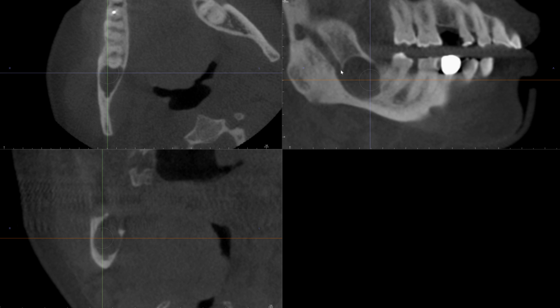That's because it's right now right up against the mandibular canal, or inferior alveolar canal, which has been displaced, as you can see, inferiorly. Not only has it been displaced, if you compare the dimension of the canal that's located posterior to the lesion, it was a lot wider and bigger, and now it's been constricted quite a bit.